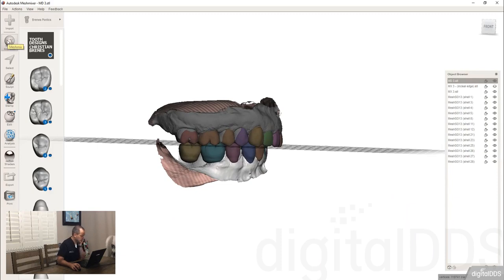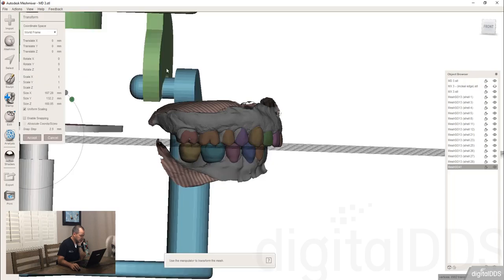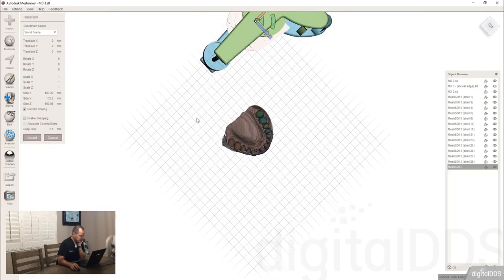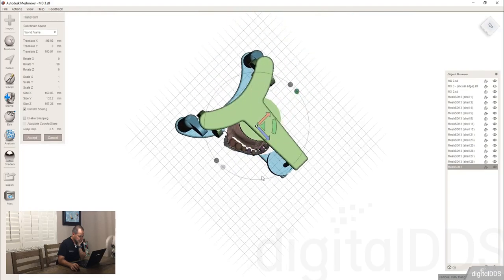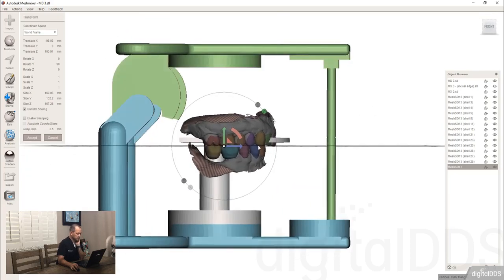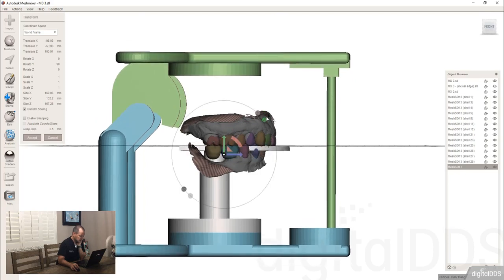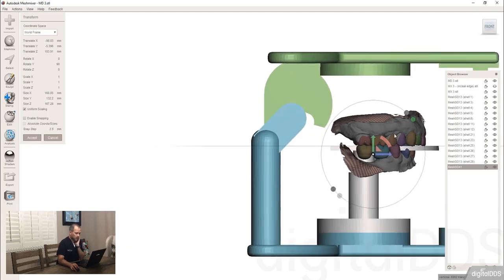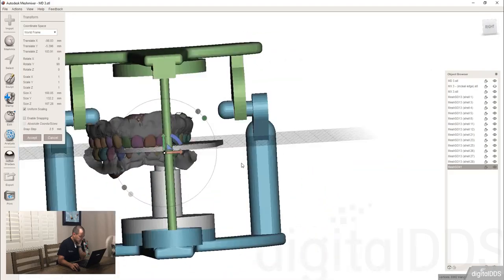So this one I don't have included in the course because it's actually my son's file. And so if you want to use the file, you drag it onto here. And after we do this, we'll be done with this video for today. All right. Notice what I've done is I've just taken this and I've aligned it. Oops, got to align it both ways.